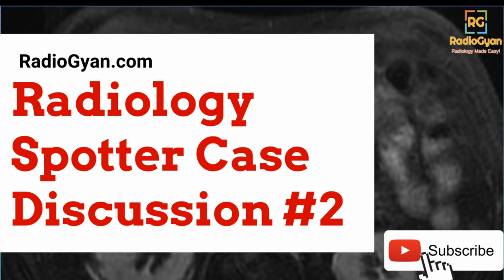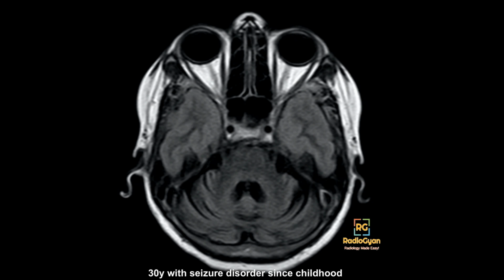So this is the first case. For those who have not had a lot of MRI postings, this is a T1 weighted image of the posterior fossa. The additional history in this case was that this patient had a history of seizure disorder since childhood. I'll give you a few seconds so that you can look at the image and type in your answers in the comments section.